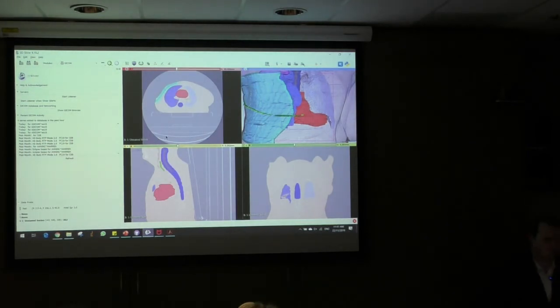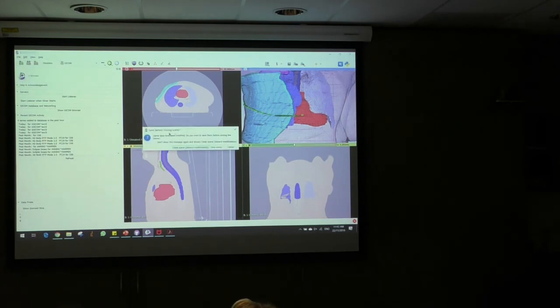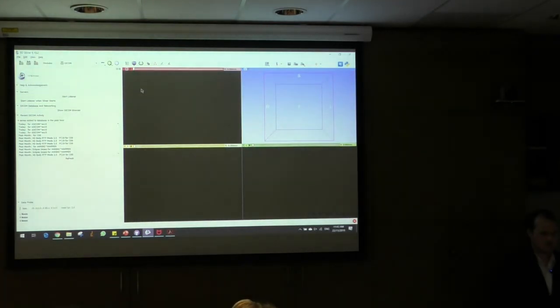So immediately you'll be introduced with a scene similar to this. Now from here you have access to the different types of functions along the top here. I'm not going to go into too much detail of what each of these do. It will take way too long. Slicer is a very big tool, a very big component, and we'll do our best to run you through just the general sort of overview of it.